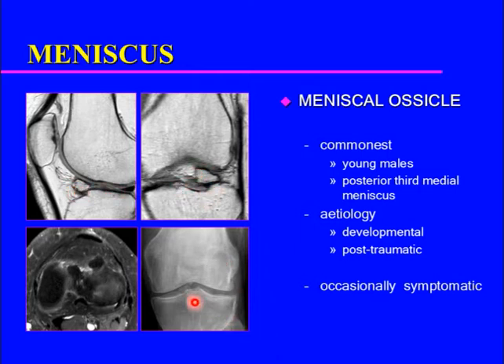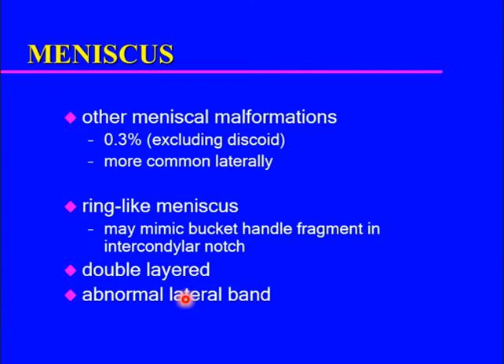It's within the meniscus. Again, I don't know whether it's obvious on the data show. You can see some sort of bone here within the joint capsule with no signs of osteochondritis dissecans or things like that. So it's just a normal variant of meniscal ossicle.